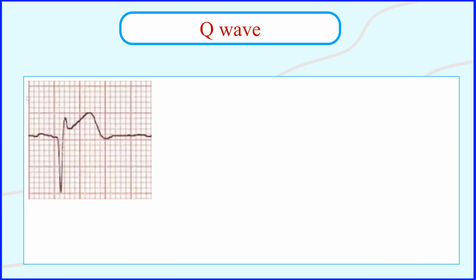Okay, let's get some examples here. All right. This lead is the aVF. I'm telling you that, guys, this is aVF. This is my isoelectric line, as we learned from the previous video. And we can just do this. Look here, there is ST segment elevation, right? And look at how deep the Q wave is. This is totally abnormal. So this indicates infarction, okay? And it's most likely to be a recent infarction because it's accompanied by an ST segment elevation.